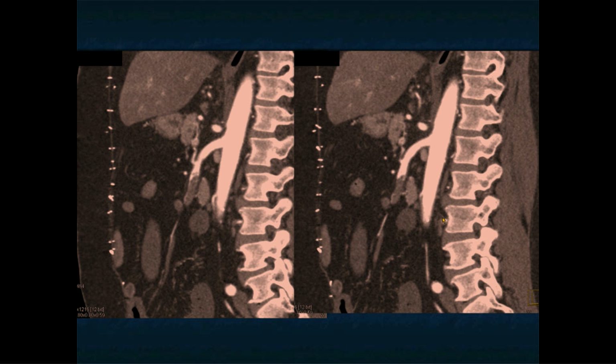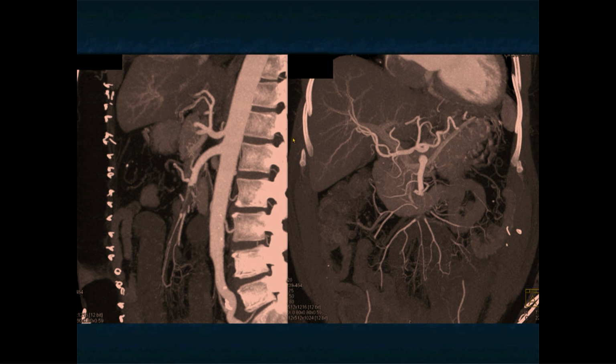When you look at the sagittal views in the patient, it's even more impressive. But again, look how nice the proximal SMA looks till it's occluded. And again, that's a very, very common area where people miss things. Again, in the MIP imaging, you would really help yourself, right? Because here's hepatic, there's splenic, but there's the SMA, and the SMA just stops. And then you see distally some branch vessels, which means you have about a 5 centimeter length of occlusion.